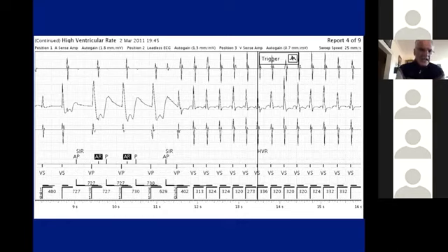It's called AR, A in the refractory. That A in the refractory is actually ignored for timing purposes, and we'll go over this in more detail a little bit later. And that's why the device paces in the A. So this is an example of competitive A pacing. And it does it again after the second paced beat.